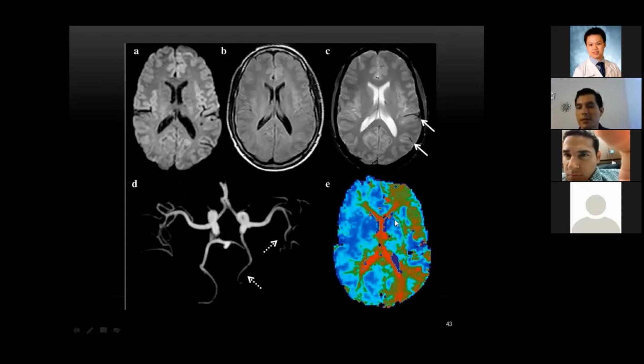In this case, the patient has language deficit and sensory motor deficit too. So in this case, it was hypoperfused. And this very subtle signal is the increase of diameter of the veins of the region.